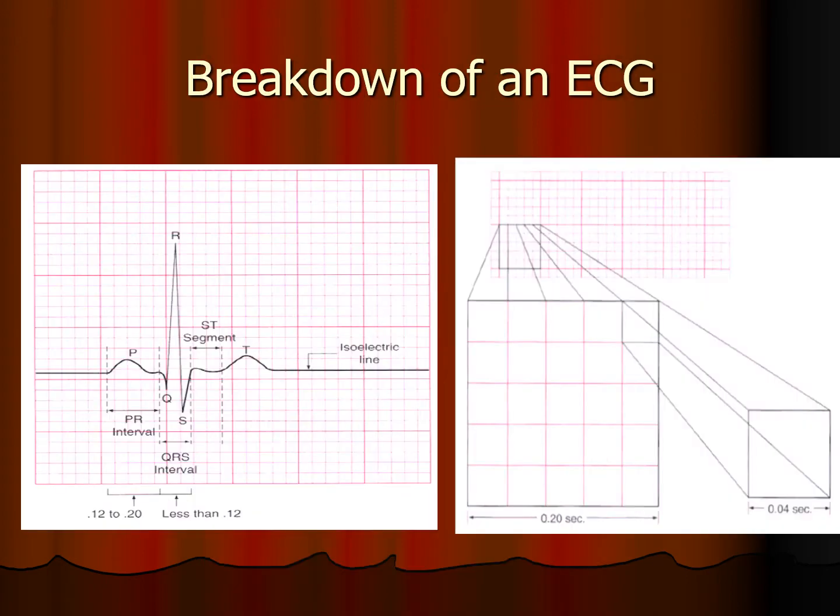All right. Breakdown. So we have the P wave, this pretty little, see how nice and rounded that is? We want our P waves upright and round on a lead 2.